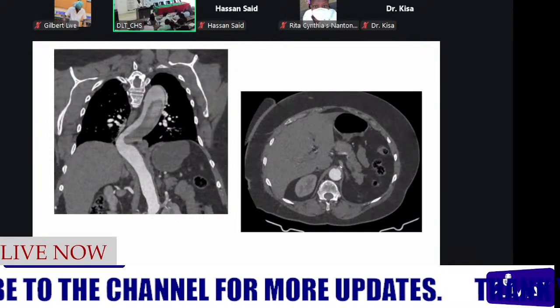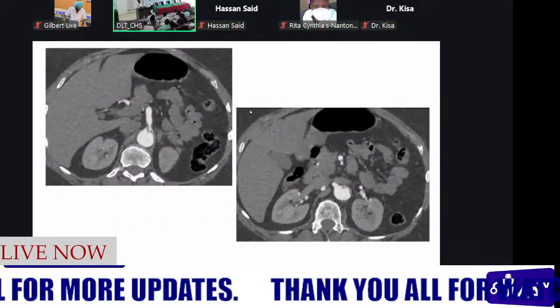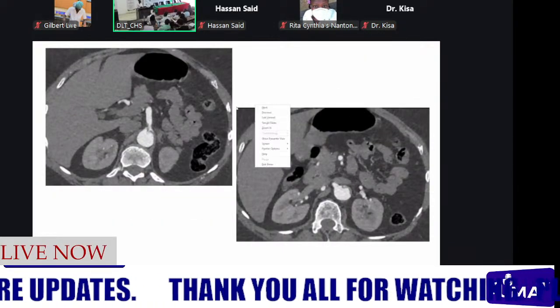So here, this structure I'm pointing at, sorry. How do I go back?